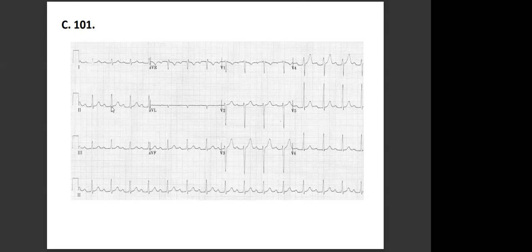Okay, period. Next one, QRS complex, width of the QRS complex. That's narrow. Good. And the axis is normal. The closest one is lead number 1. So this is why it's 90 or 80 degrees. This is what we have. That's it. So far, this is what we learned.